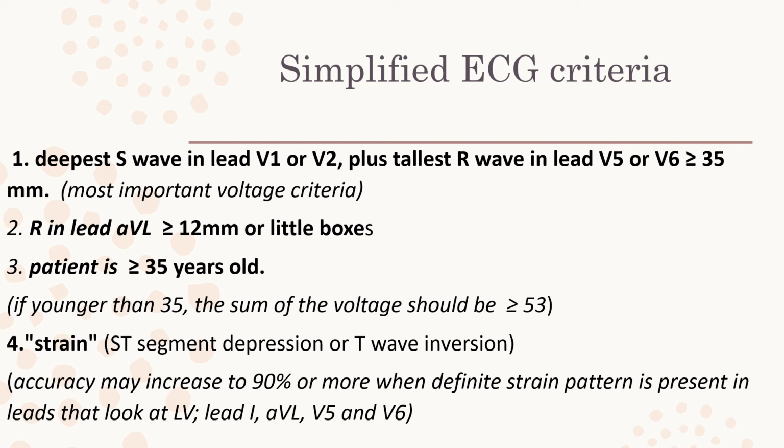And that is one of the easiest ways to remember left ventricular hypertrophy: look at whatever is the biggest one in V1 and V2 and add it to the other one of V5 or V6.